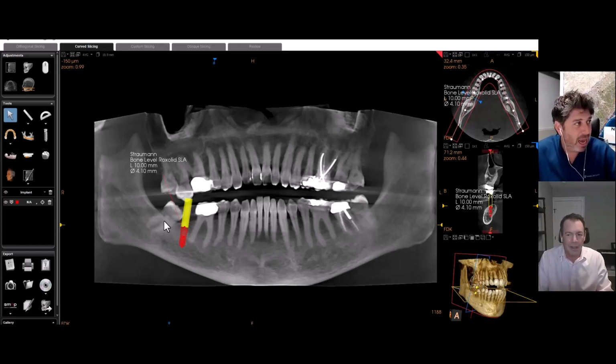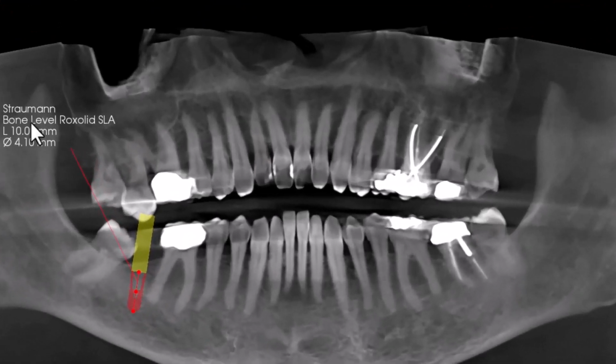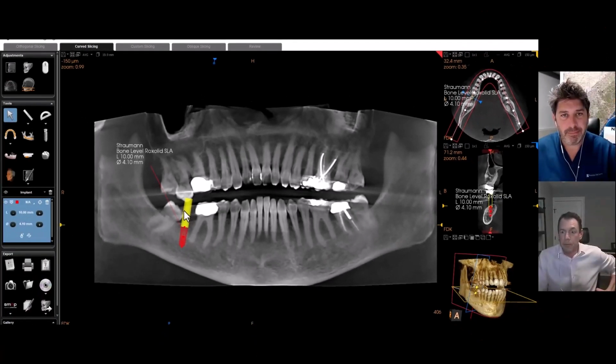Right, exactly. But if you look at the anatomy of the adjacent roots, the distal buccal root on tooth number 3 is pretty posterior, and there's the sinus in the area. So while not so challenging, it's a little bit more involved. So if we can keep that tooth, we'd probably be better off. So ortho is probably the best, minimally invasive route for the patient, right? Yeah, longer. But it's just going to take longer. That's right.